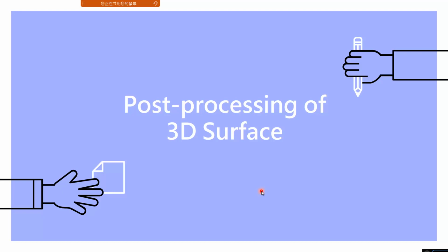You may find out right now we have the basic skills to construct the surface model of the 3D object. You can do that through the isosurface. You can use the patch for the display. And most importantly, if you are dealing with an anisotropic image volume, you can use the code that is provided to you, the isotropic volume, to correct this kind of issue, right?